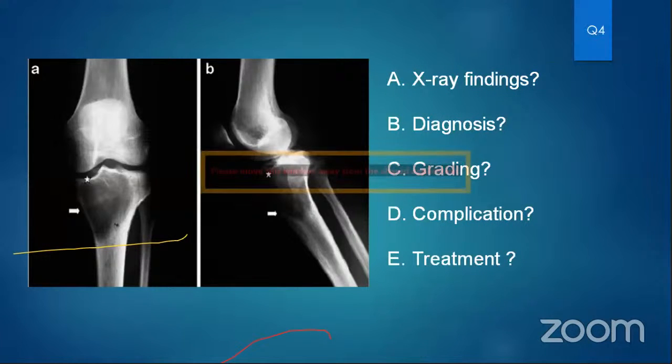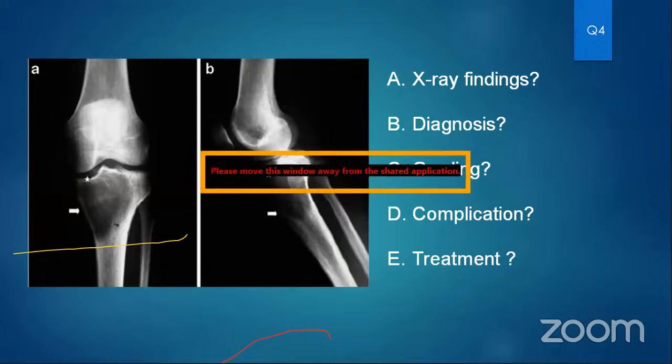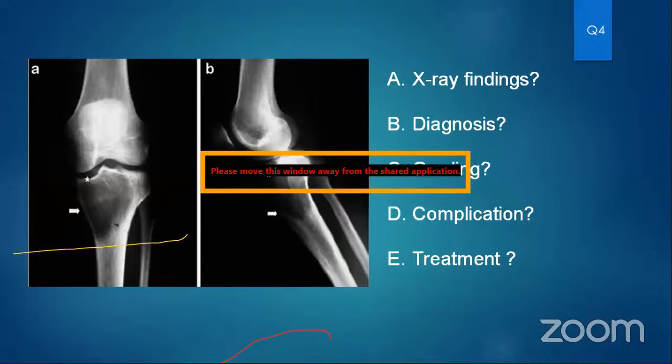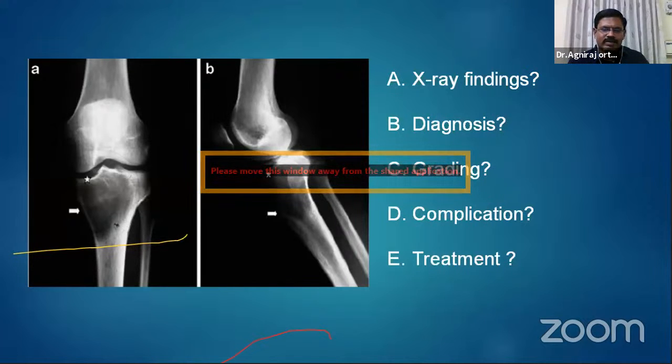The bone graft is above, in between is the gel foam, and here is the cement, sir. Cartilage will be preserved, sir. The heat generated from the bone cement will not transfer into the bone graft, sir. So that is called the sandwich technique. We use gel foam. Okay.